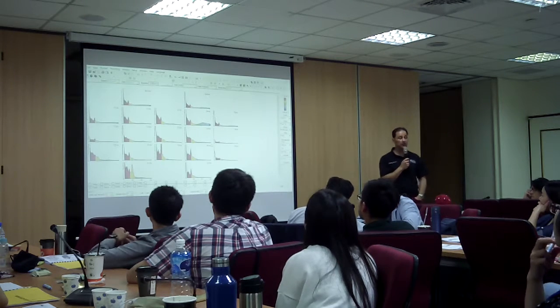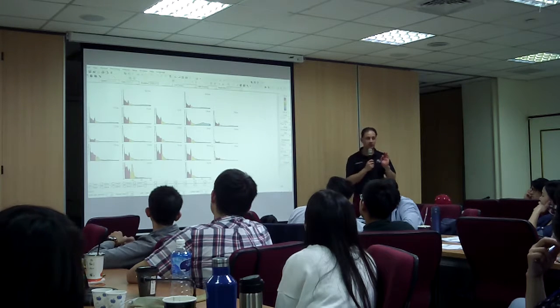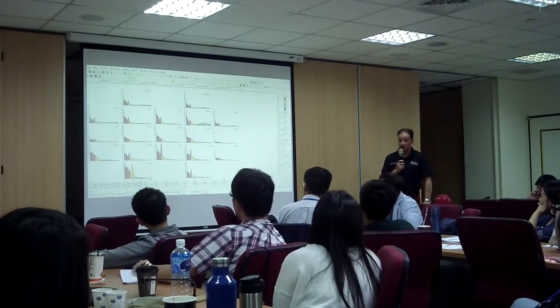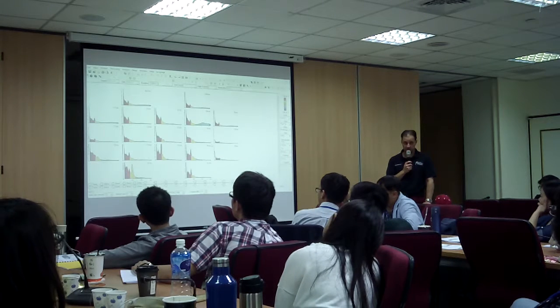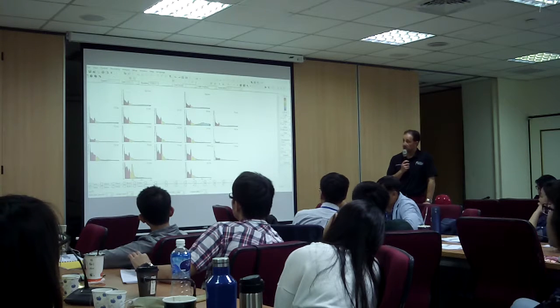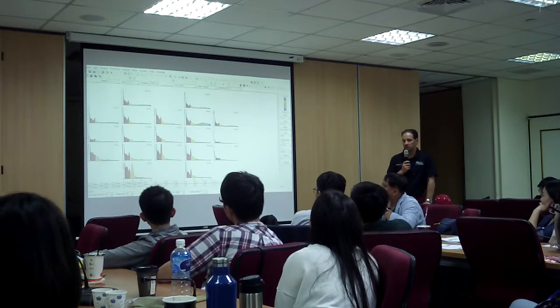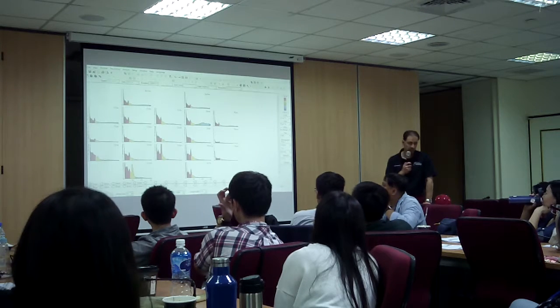So what do we look at to decide the protocol? What things do you need to look at? What do you think? So first of all, on this EEG we have a particular feature, which is what? The epileptic discharge. So we cannot ignore that. All right. So where is the epileptic discharge? What's the source? PZ to P4. Right. So as you're generating right there, we need to put a sensor there and train that.